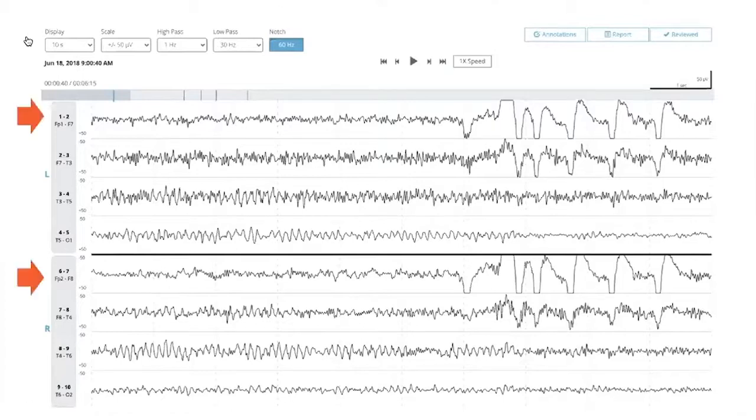Now, looking at these front electrodes, it's very important because you need to understand when the headband is set on the brain, basically electrode 1 and 6 will be in the front, right above the eyes. And when somebody blinks their eyes, you will see a potential generated. And don't mistake this for a seizure waveform, especially if it has this shape of waveform that you are seeing.